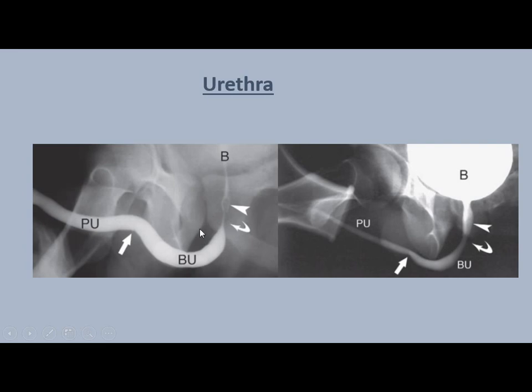The point is to differentiate between retrograde and voiding cystourethrography: the posterior urethra is better visualized in the voiding one, because of the presence of, I think, valves. It will fill in the voiding study, while in the retrograde one it will not fill properly, because the contrast, when it passes the membranous urethra, will pass freely into the bladder.